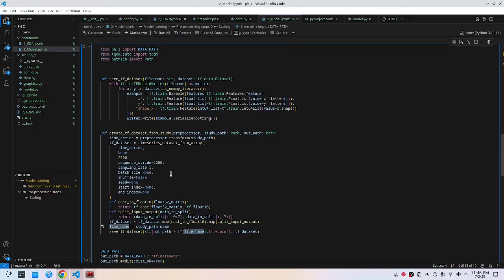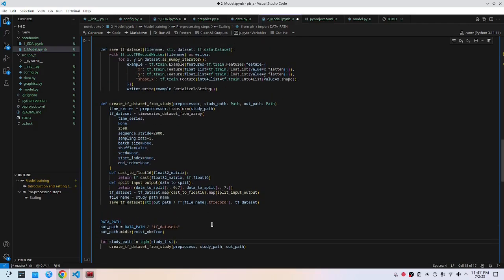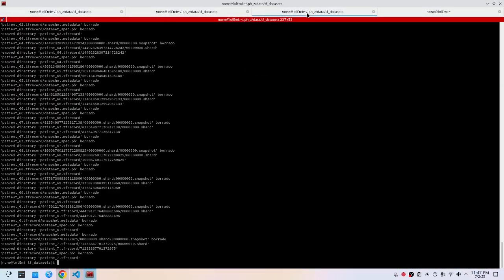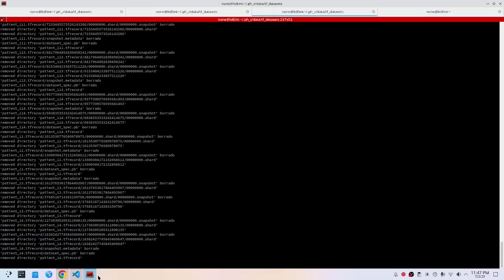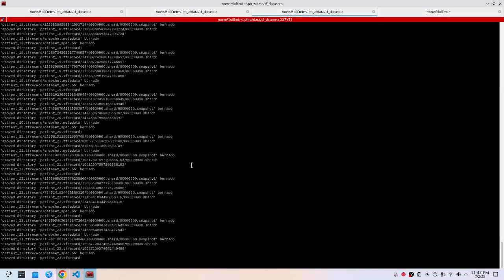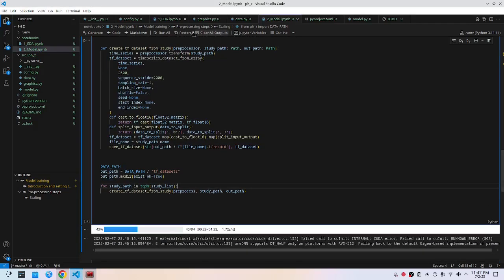You're going to X, to Y, the shape X, the serialization. Let's remove this, then we can just create a nice function for this. And let's remove what we have here. This is my disk, trying not to die. I kill this.